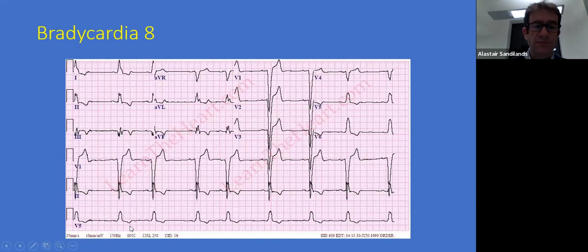So here's another example. 6, 7, 8, 9. So it's roughly a bradycardia, intermittent bradycardia. I just put it in as an example really to show you. So we have a broad QRS, certainly greater than 3 small squares. Okay, we do have an irregular rhythm. Again, the algorithm may not allow for this. We do have P waves before every QRS, so you can check P, QRS. Every time there's a P wave, there is a QRS, but there is a broad QRS.